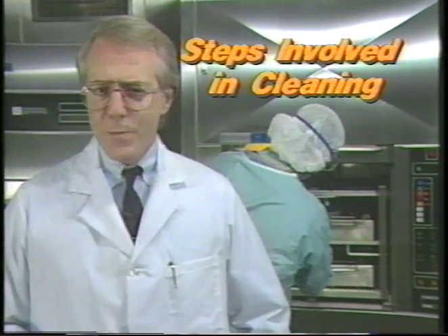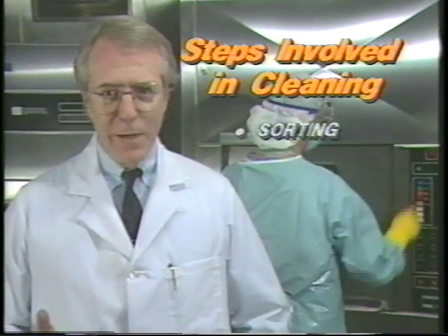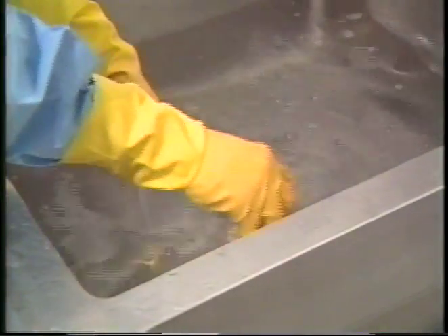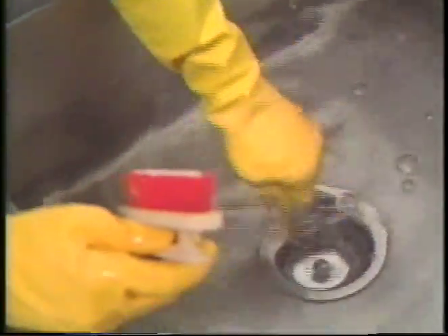Now that we've discussed the components of the washing process, let's begin to review the steps involved in cleaning. They are sorting, pre-washing, washing, rinsing, and drying. Dried-on soil presents a difficult challenge to any type of cleaning, be it manual or mechanical. Good results can only be expected when the devices are washed promptly after use. In cases where this is not possible, the load should be kept moist and covered to prevent drying and cross-contamination.